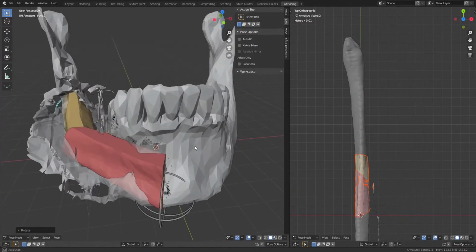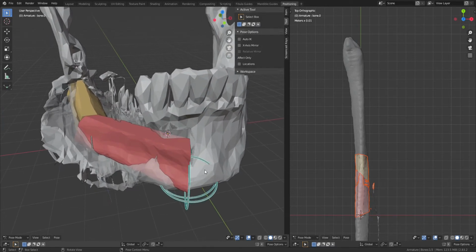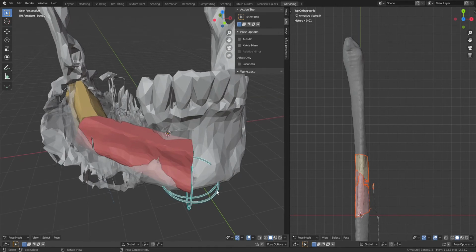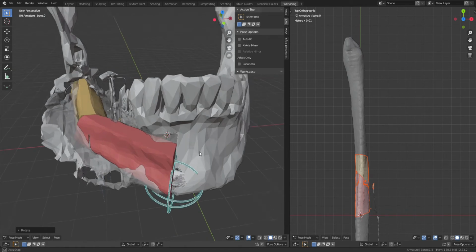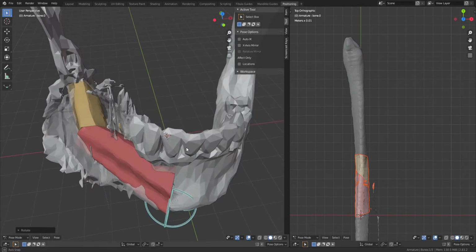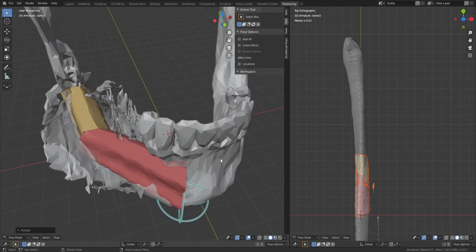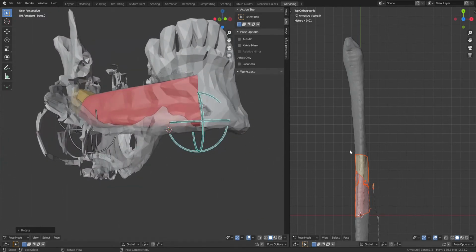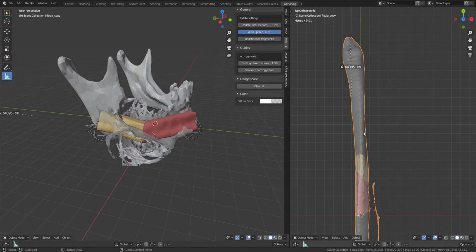Okay, the lateral incisor, or the number 42 tooth, will be pulled out, and the cutting plane must go between the central incisor and the canine. Okay, so we'll have to choose the segments.